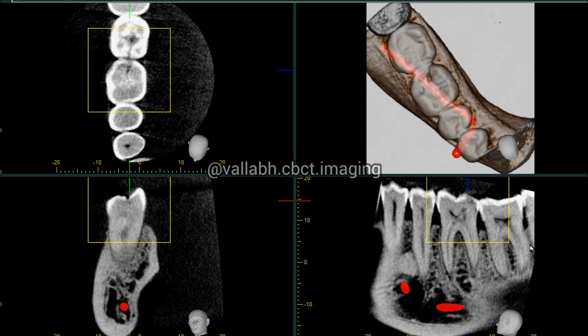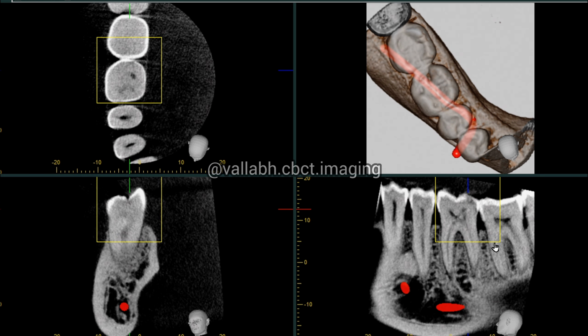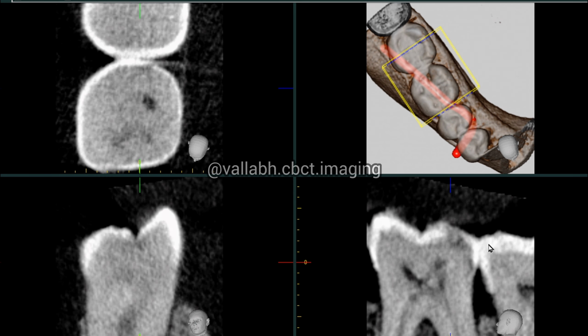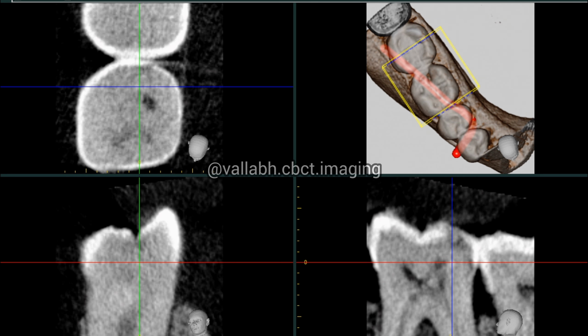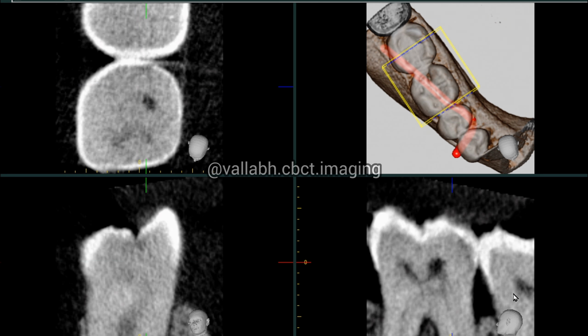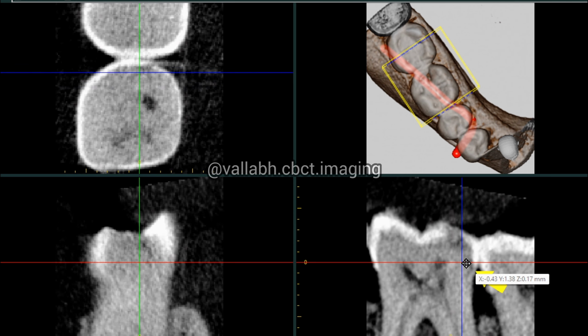We'll just zoom this part of the image to study the line. So this is the line that was studied. You can see here there's dentinal caries, very well evident dentinal caries with fracture of the distal cusp. You can just see it over here. We'll just arrange this, and we can also appreciate some kind of line over this side. So this is the dentinal microcrackline like appearance on the distal aspect.